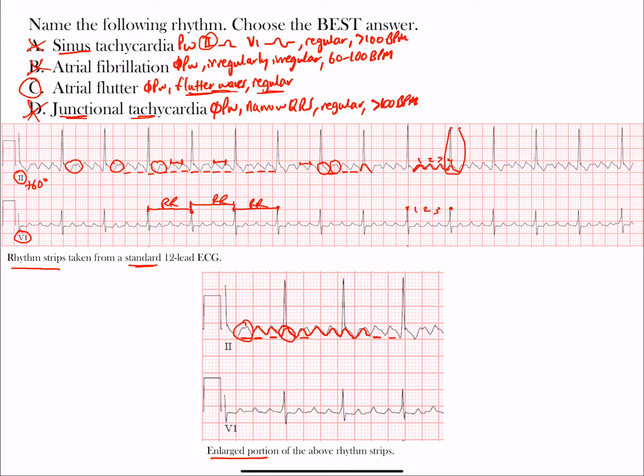So what do we call that? We call this atrial flutter with 4-to-1 AV conduction. So that's actually what it's called, and remember that 4-to-1 is the 4 flutter waves that we saw here and the 1 QRS complex. Now it can be variable, and we would call that atrial flutter with variable AV conduction, but we don't see that here. If you look at them all throughout, you have a regular flutter going on here, atrial flutter with 4-to-1 AV nodal conduction.